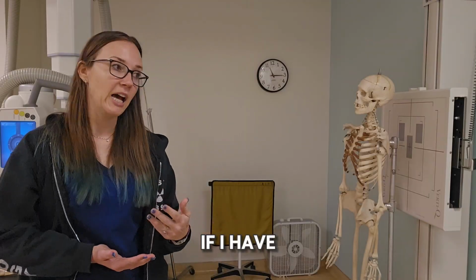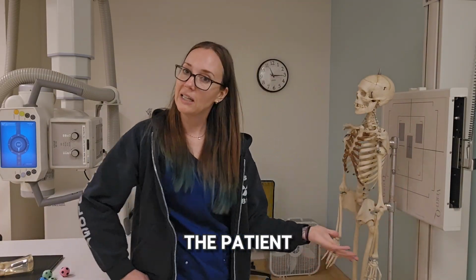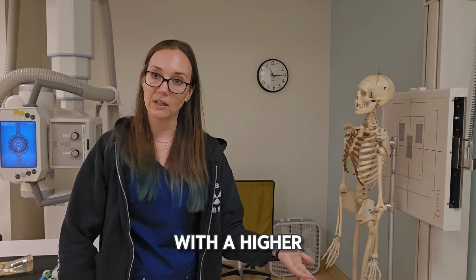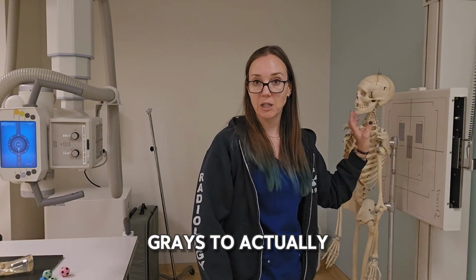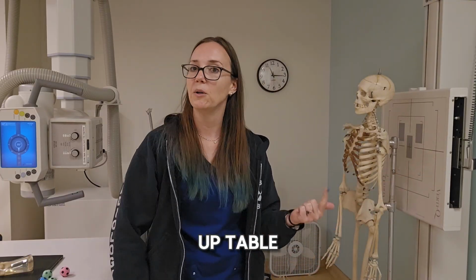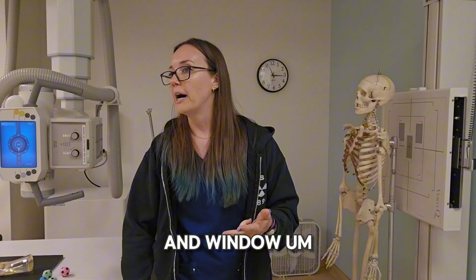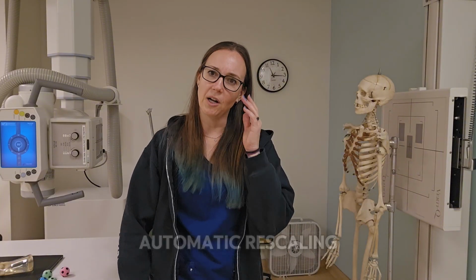Therefore, if I have more X-ray photons hitting the image receptor of the patient, yes, patient dose does go up with a higher kVp. But mostly what it does is it allows more grays to actually hit the image receptor, which we can manipulate with things like the lookup table and window width and windowing and all the different things inside the histogram when we do automatic rescaling.